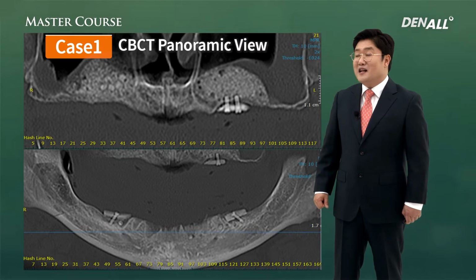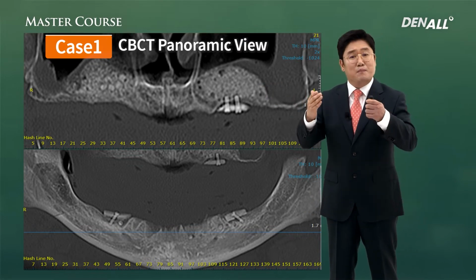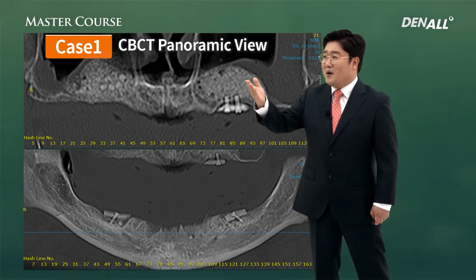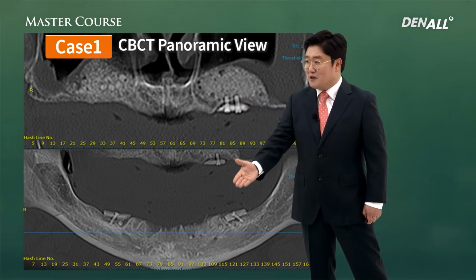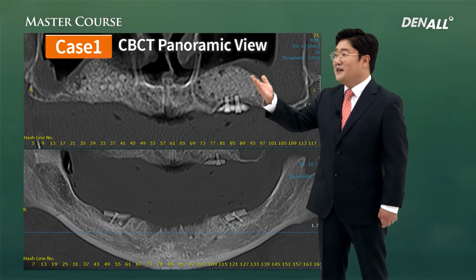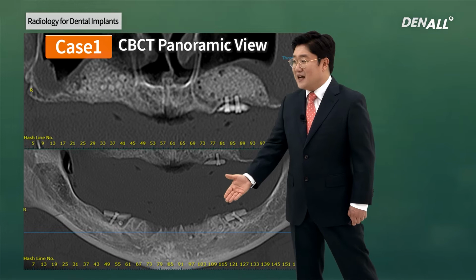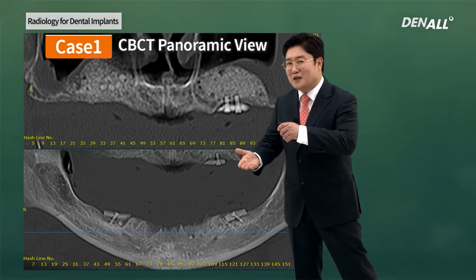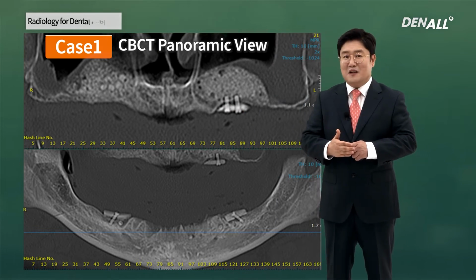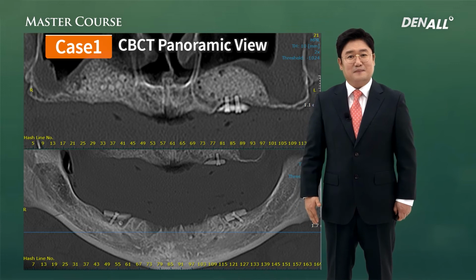Cone beam CT cuts have been recomposed for panoramic view. So panorama view is made of CBCT cuts. The graft positions and amount can be checked. Important anatomical structure, the status of sinus and inferior alveolar nerve, the location and its relation with other structures can be definitely checked with the CBCT.